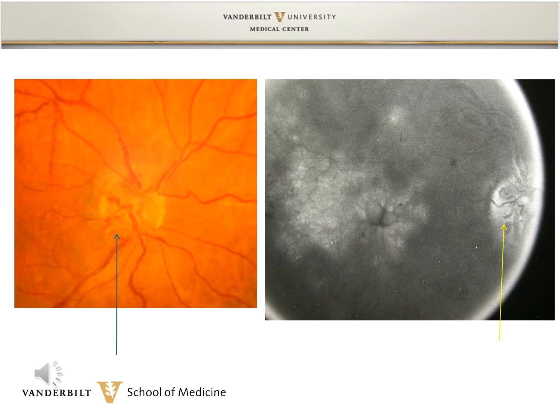neovascularization. The fluorescein angiogram shows not only the severe cystoid macular edema, but I want to point out that these vessels on the nerve do not leak. They are dilated normal vessels, so they still have their tight junctions, and therefore they do not leak.